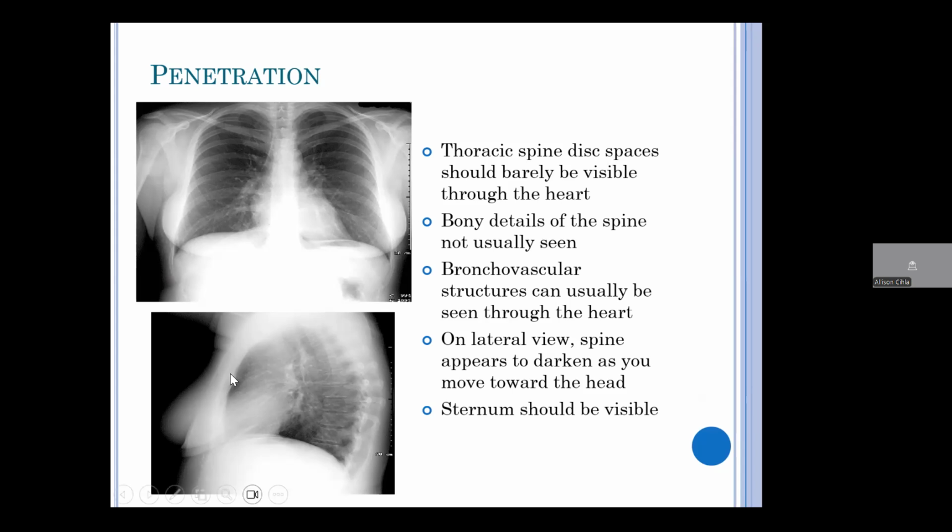Can you all see my arrow? Yes. Okay, yes. So this is the sternum here.